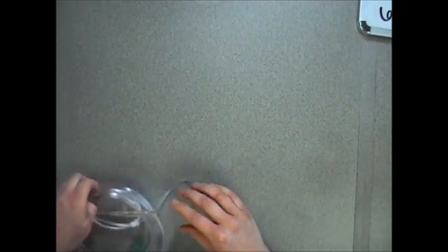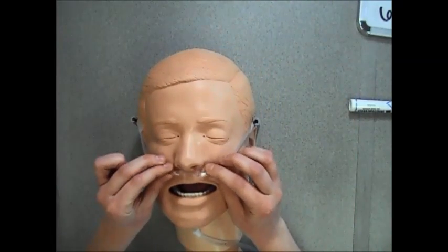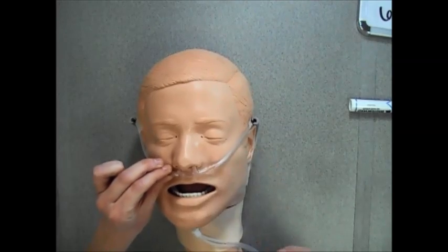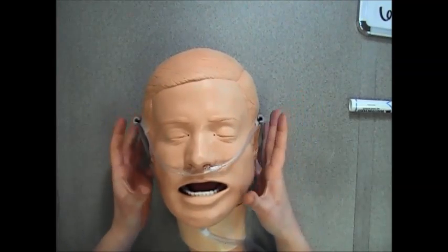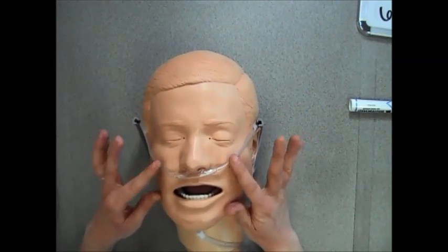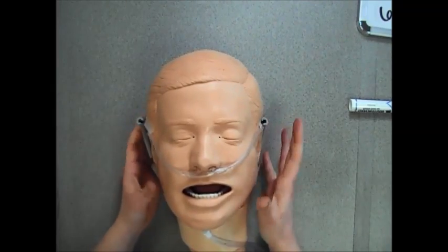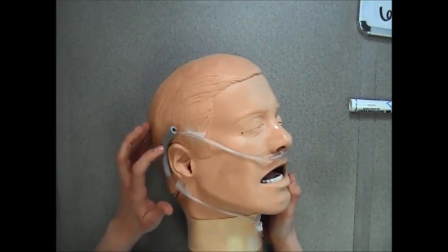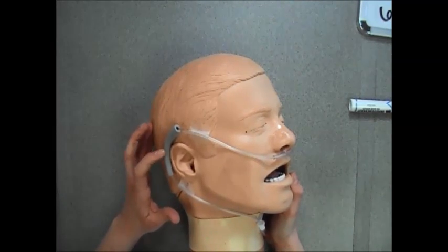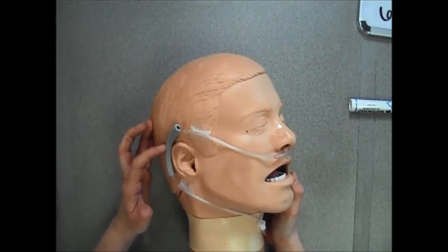Okay? I want to show you our mannequin here, and you will notice that these prongs are tilted in the nares back towards the patient. That allows that patient to receive all of that oxygen. You're going to wrap the tubing around his face and around his ears here. You will notice that on the sides of the nasal cannula behind his ears, I have used foam ear cushions to prevent the development of pressure ulcers behind the ears.